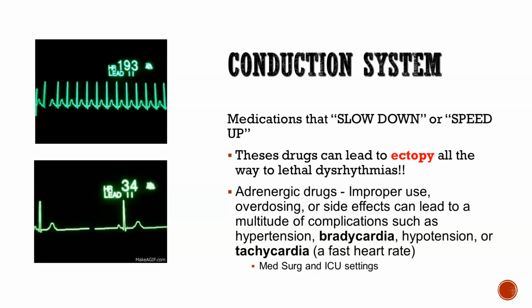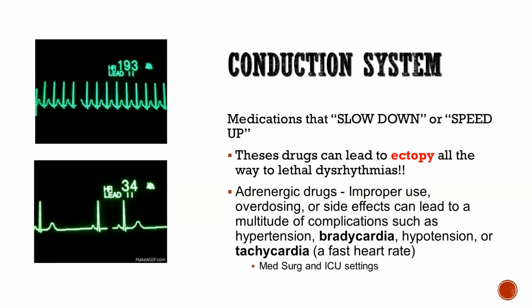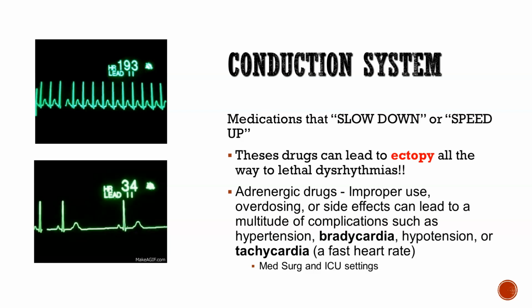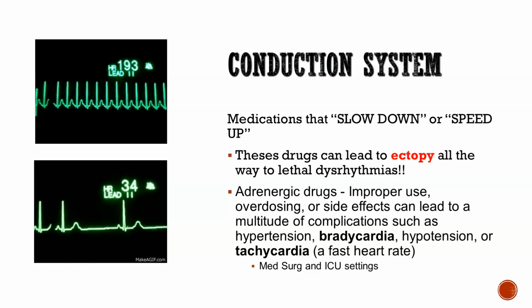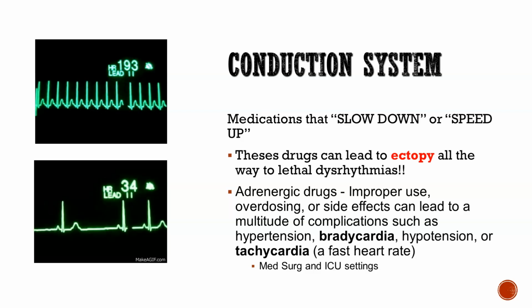In the upper left-hand side, we have an example of a tachyarrhythmia called SVT. I know it's SVT because the QRSs are tall and skinny. I can't necessarily see a P wave, and that's because it's a machine, and it's trying to record everything that's happening in 6 seconds, and it can't fit that P in there. But we will say, when we talk about atrial dysrhythmias, that we know if it's skinny, if it's less than 0.12 seconds, that it's going to be in the atria.